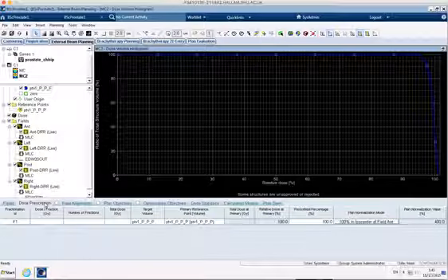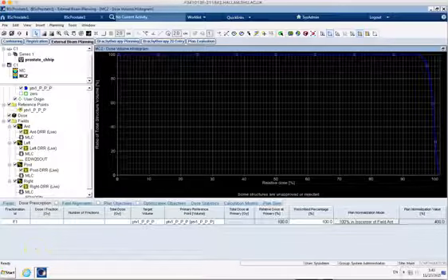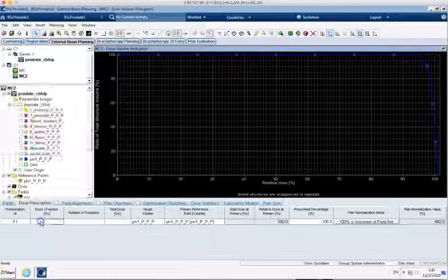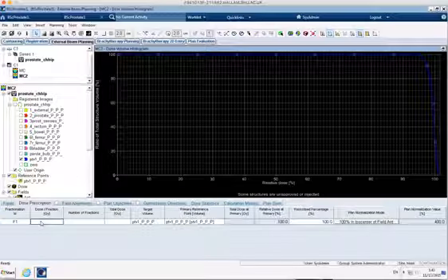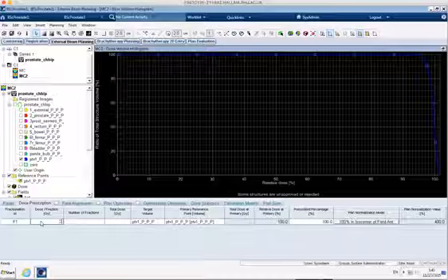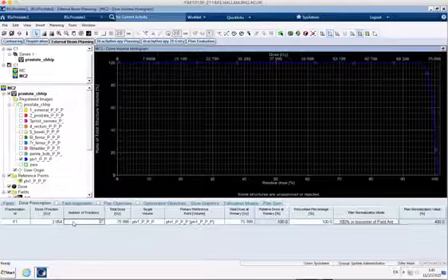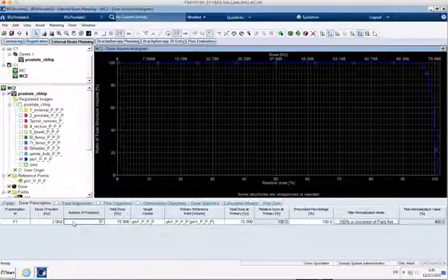So we need to tell it the dose fractionation. If I click that tab down here, across here, dose prescription, my dose per fraction is 2.054, and we're doing 37 fractions. And there we go, we've got some dose on our DVH now.